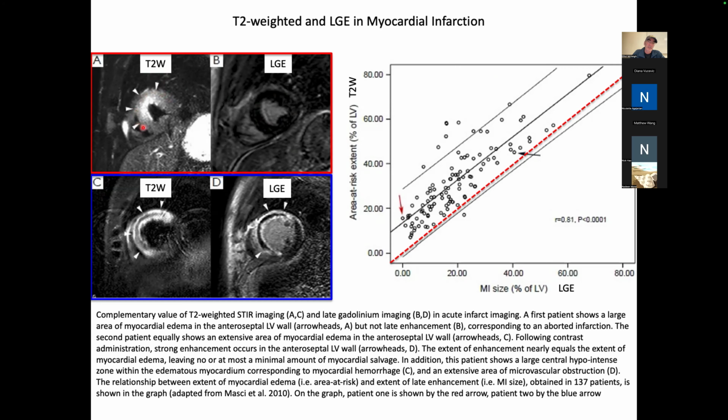However, in this same patient, when you look at a very heavily T2 weighted image, you can see that there's this differential contrast in the myocardium, in that there's a huge chunk of tissue here that has a much longer T2. That is, we're seeing a brighter signal at a later time. So we get this increased T2 or brightness. The question is, what is this from?